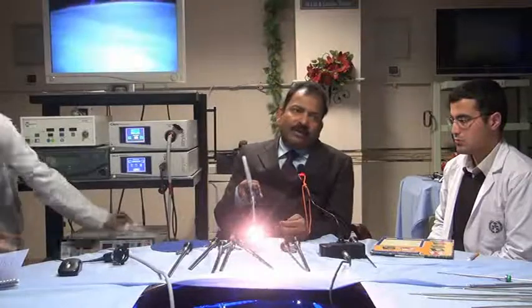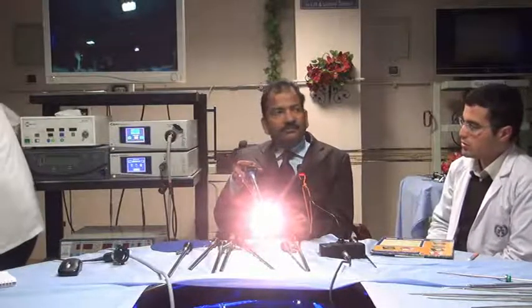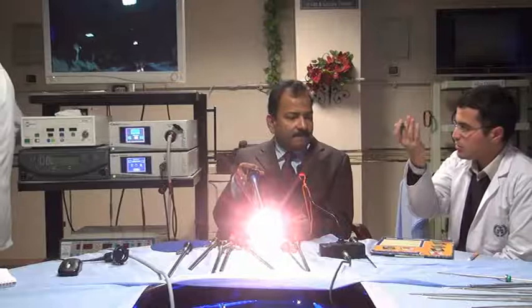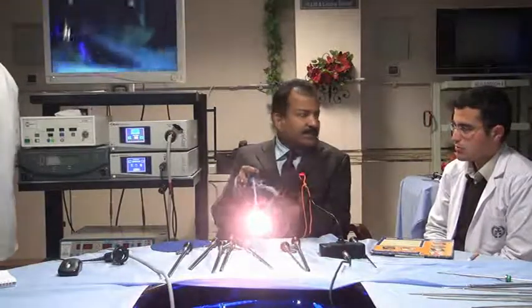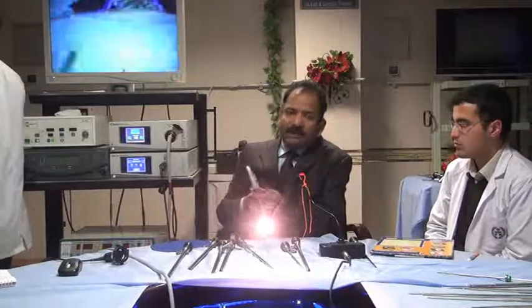In 30 degree we should hold it like that. In 0 degree we should hold it like that or hold it like this. No, in 0 degree there will be no difference. The fiber optic. No, but in 0 degree even if you rotate, nothing happens, because it is a perpendicular cut. But even in 0 degree you should keep it up.